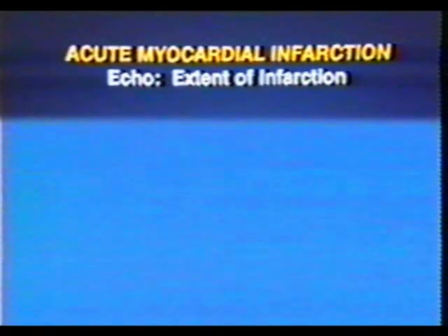We have now illustrated how echocardiography can be used to determine the extent of ventricular dysfunction with myocardial infarction. In the acute setting, this usually provides a slight overestimate of the infarct size, since some of the abnormal segments can be severely ischemic or stunned rather than infarcted.